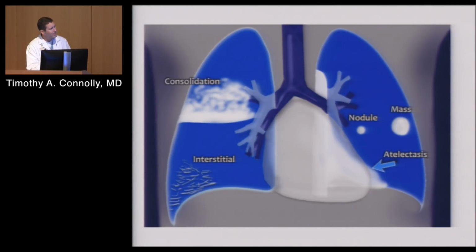Atelectasis, where there's been collapse of lung tissue, and so you get that white shadow. Consolidation, which is a pneumonia. Again, you get dense infiltrate, which causes that haziness or clouding. If there's a tumor, whether it's a nodule or mass, and we'll talk about the distinction later. And then if there were pleural fluid here, rather than these interstitial markings, that would be the other main reason why you might see it. So before you start throwing out, maybe it's pneumonia, maybe it's cancer, try to think of it in those 4 generally descriptive terms. I think it's much more helpful.